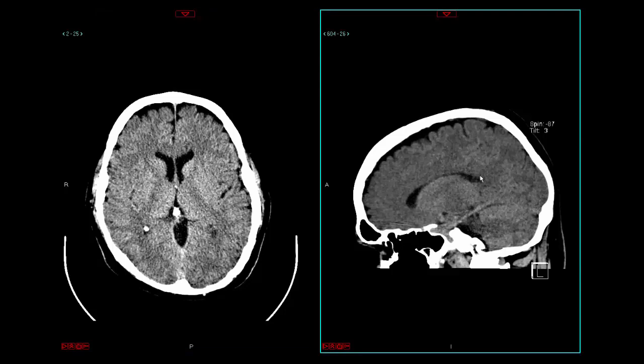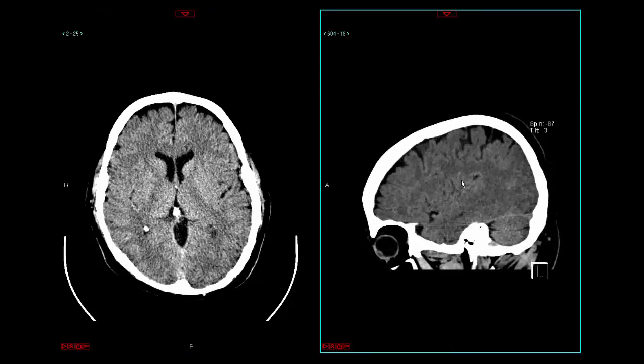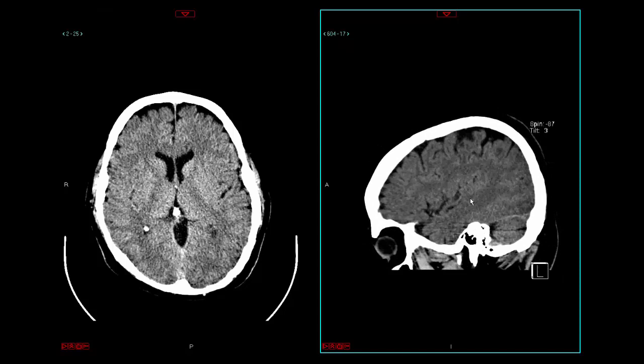That is going to be probably better depicted on the sagittal imaging as we get here into the temporal lobe and the superior temporal gyrus. And once we get into this area here, we're really considered to be Wernicke's area. As we mentioned before, this area here is the inferior frontal gyrus, and these little lobulations, all which have little names, that's going to be considered Broca's area here. So consider that Broca's area, and consider the posterior portion of the superior temporal gyrus, Wernicke's area.